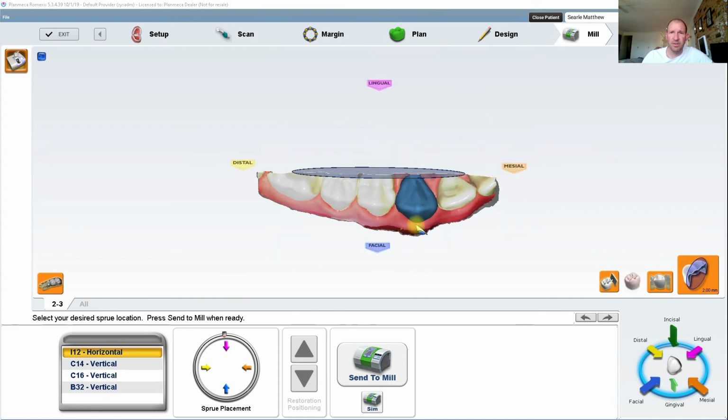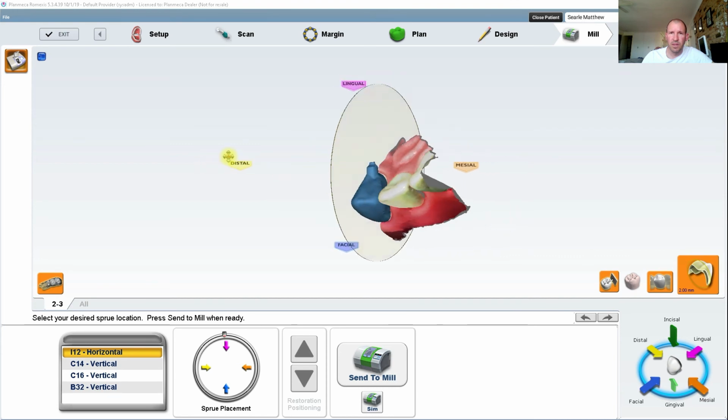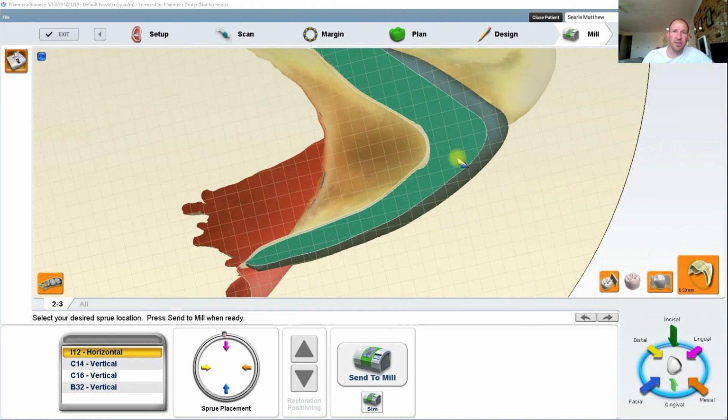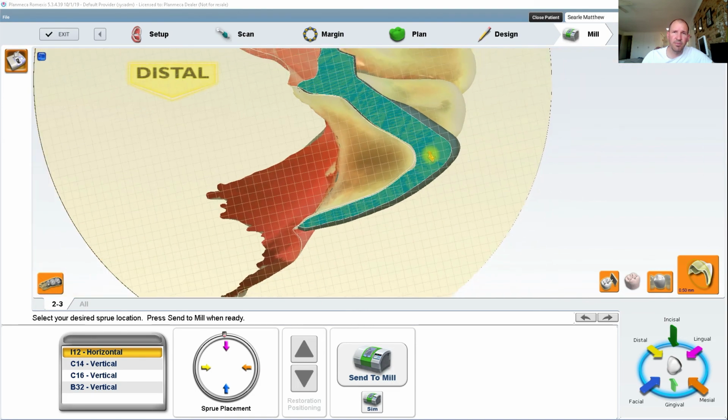And we use a slice tool. So you'll see when we're on standard, our slice tool, because we're using larger burrs to mill it out, it's going to mill it out faster. It's going to take a little bit more out of your more refined areas, sharper edges.